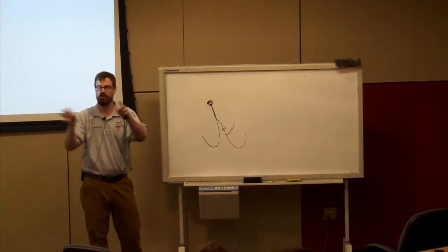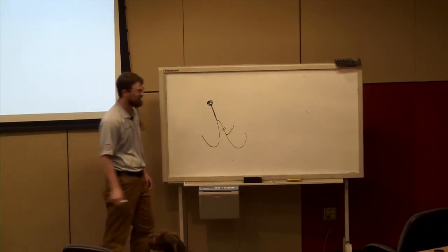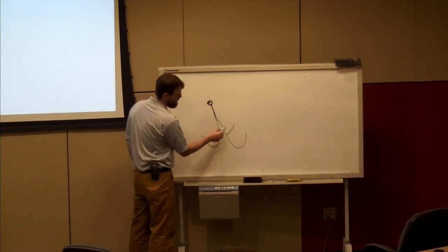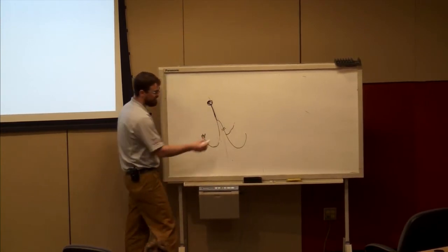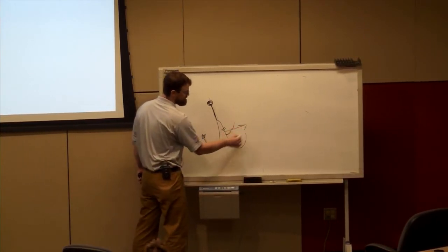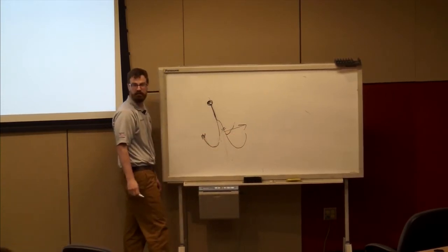The thing that's difficult to distinguish, and the reason we want to pair right bundle and left bundle together, is because they give me a wide complex rhythm. What happens? I get a fast depolarization of this ventricle, but slow depolarization of this ventricle, so I end up with a wide QRS complex.